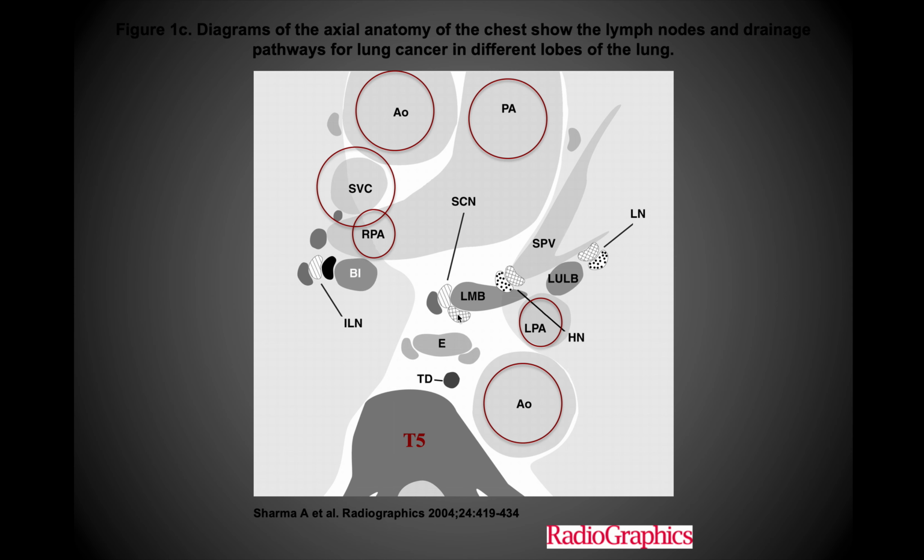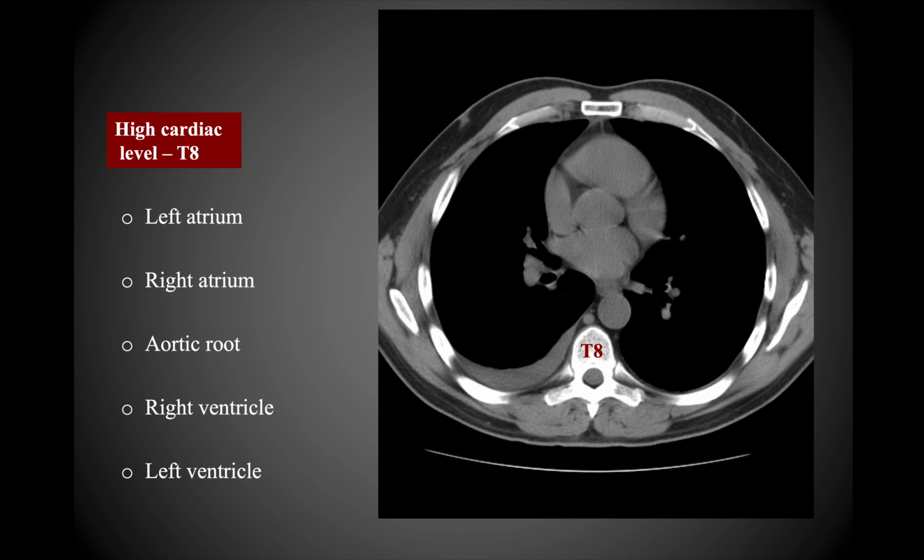And then you can see once again some of these lymph nodes that we had talked about previously, and then once again you can also see the bronchi over here and over here, as well as this right here. These are all representing bronchi. So we're past the main stem bronchi, now they're branching into additional branches. And so then you can still see the esophagus coursing just anterior to the location of the vertebral bodies. And then thoracic duct, again, you're not going to appreciate that very well, but you should still be able to see the azygous vein as it's ascending.